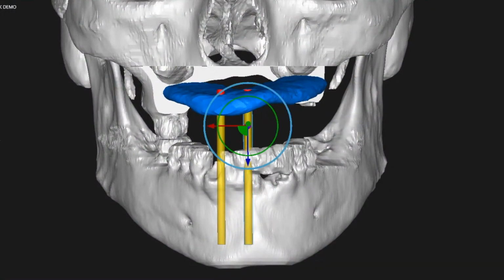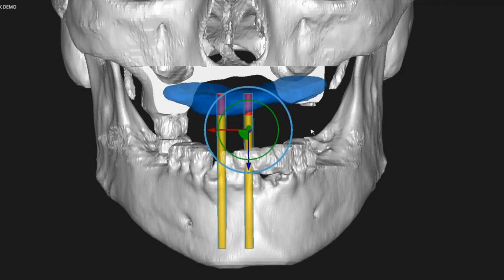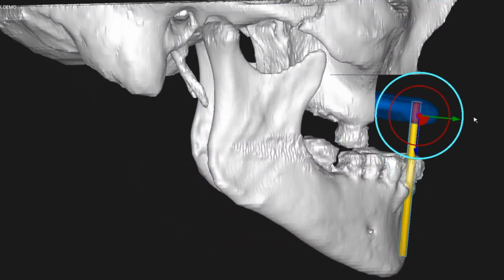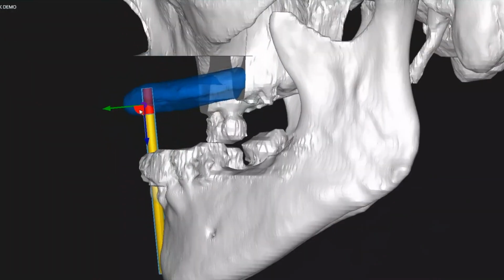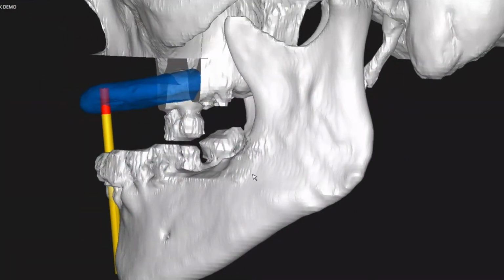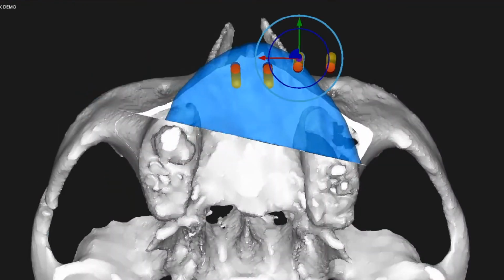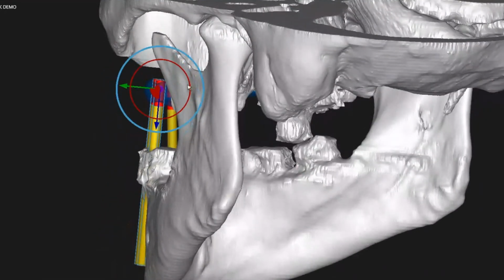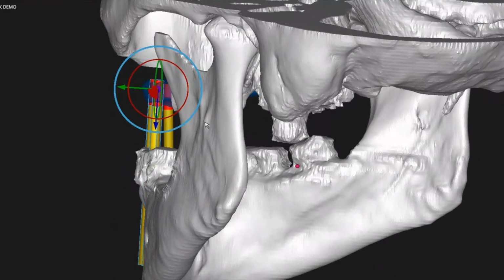What's that depth you've got there? Yep, these are 8 millimeter. Yeah, even that is pretty big for this. That's why we might even need to do... I suppose 8 is the... Yeah, that's good.